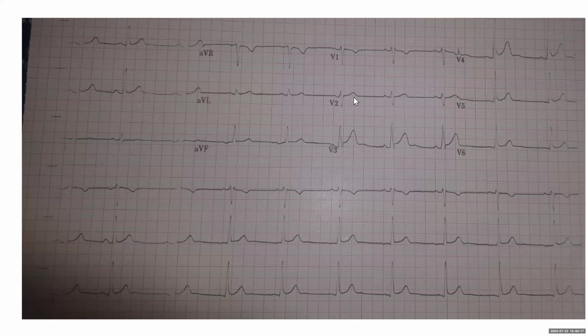I think because it's overcalling, you mean. Yeah, I agree. In real life, yeah, overcoding. This is probably not pericarditis, but 5 codes sometimes can be challenging. So unless you have an obvious 5th code, I think you have to learn, as we discussed, to use these non-specific codes or double codes or things that could be correct for the exam, but not necessarily for real life. Good.